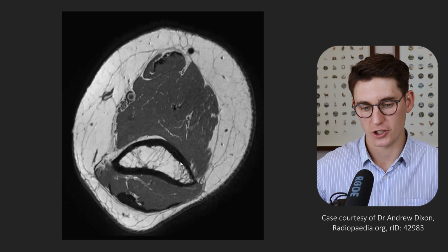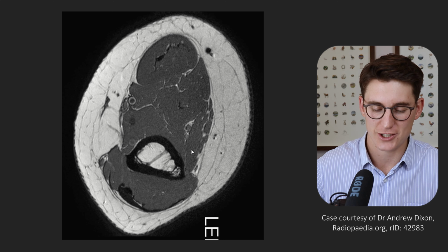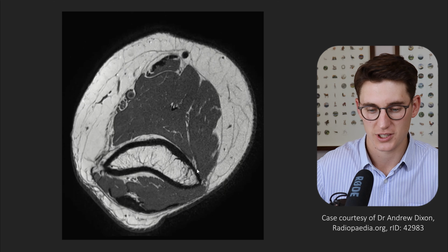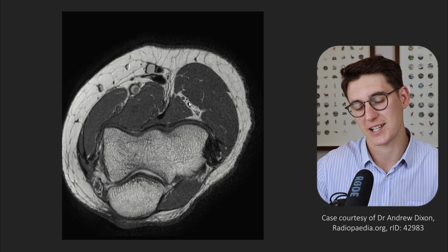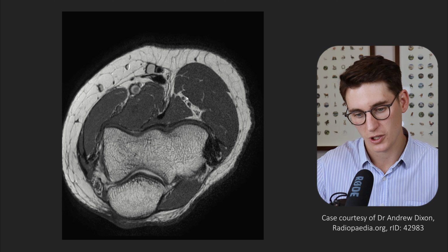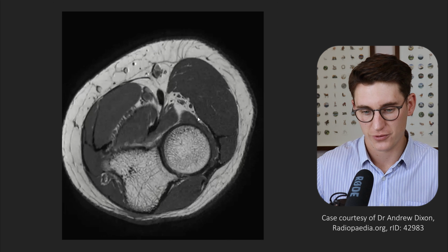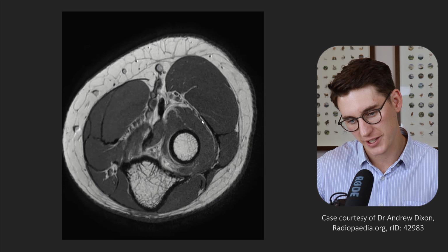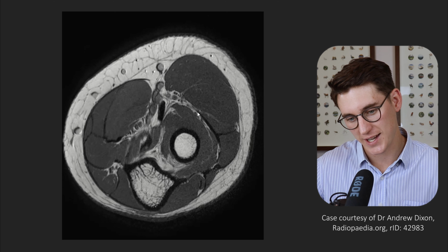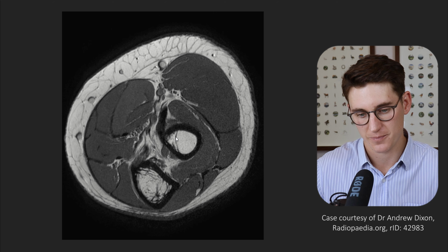Let's look for our radial nerve. We know that our radial nerve starts posteriorly and then wraps around the humerus laterally and heads into this anterior compartment. The best way to find it is to go to the elbow joint and see this large brachioradialis muscle here. Posterior and slightly medial, we should see these 2 radial nerves. They've split here into superficial and deep branches. As we head down further, we should see this supinator muscle come around between the brachioradialis and the supinator muscle here. We get that deep branch heading backwards, giving us our posterior interosseous nerve here.